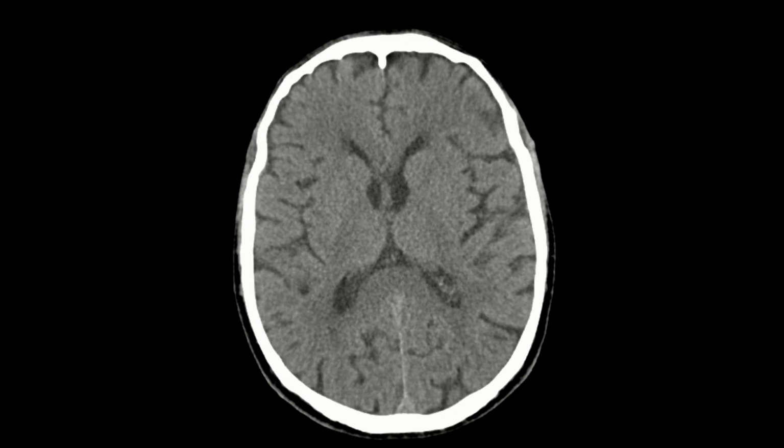Next, we're going to look at the level of the insula. Here, this particular section, how I look at it is the poles, the anterior cerebral artery and posterior cerebral artery regions. They are kind of these heart-shaped territories on either end, something like that. This kind of reminds me of those Rorschach pictures which they use in psychiatry, where they have these ink blots which form these symmetrical patterns, and each person perceives it differently.